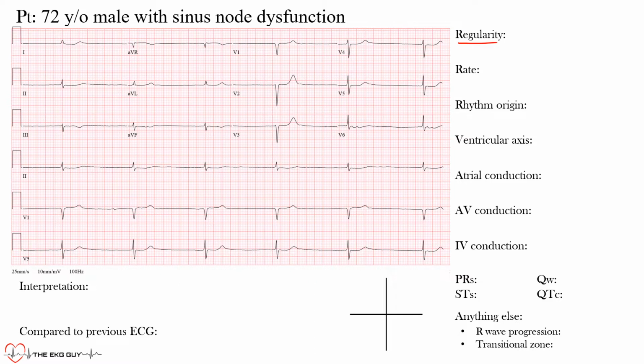What we want to use here are these rhythm strips down here. This is a standard 12-lead EKG, and these bottom leads here are 3 rhythm strips, okay? And what we want to look for are intervals being consistent throughout. We typically look for these R waves here, okay? These are these positive deflections here, and you can see that there's about 6 there.